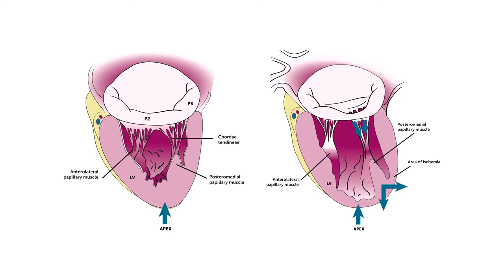Yes, and you can appreciate how tender the mitral valve is again from these beautiful images here. You see that the anterior and the posterior leaflet coapt along a certain surface here. And you can imagine that if you have just a little bit of leaflet retraction or tension on the leaflets or a part of the leaflet which is ruptured, you can easily get significant mitral regurgitation.